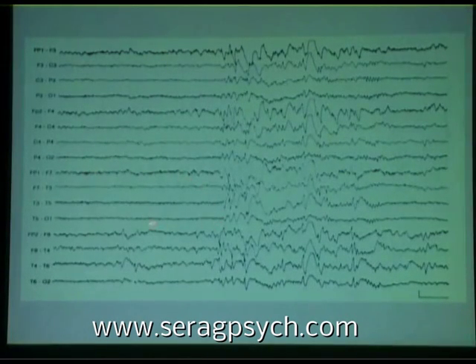Nothing wrong here. Everything is fine here. But notice these rhythmic waves with intermingled spikes on the right, all abnormal. And then suddenly that leads into this bilaterally synchronous discharge, a little higher voltage in the right as compared to the left, but very definitely bilateral. So you have this focal onset of generalized spike waves here. And then, unlike the usual generalized spike waves, there's a focal offset. So you go from a focal onset to generalized spike waves to a focal offset.